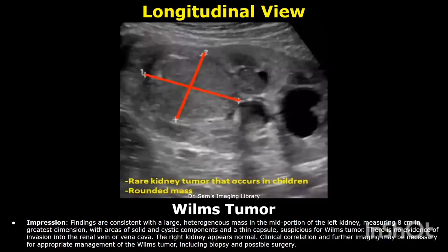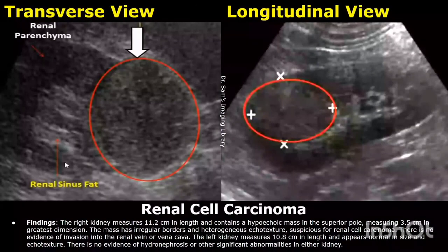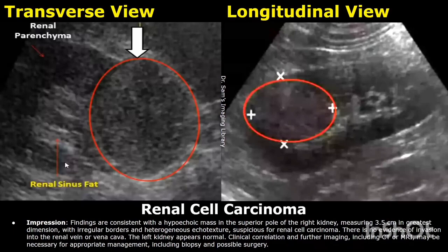The findings for renal cell carcinoma usually include a hypoechoic mass with irregular borders and heterogeneous echo texture. These findings are written in the impression. The hypoechoic mass with irregular borders and heterogeneous echo texture. These findings are suspicious for renal cell carcinoma.